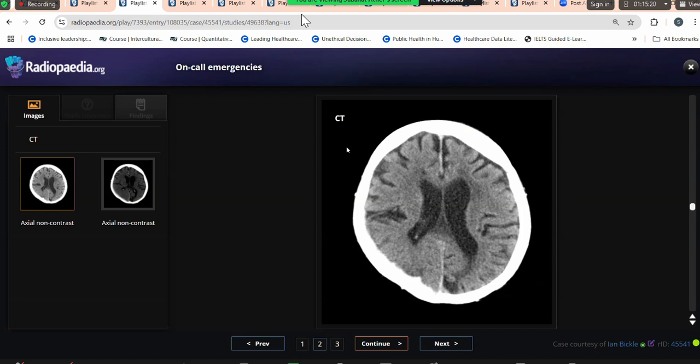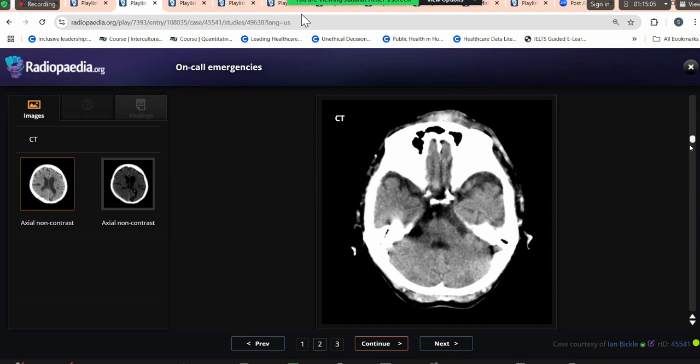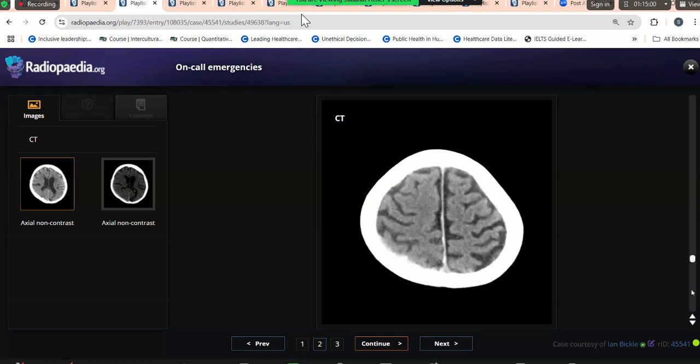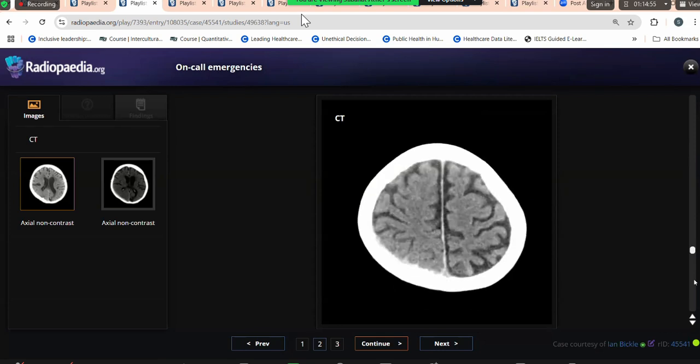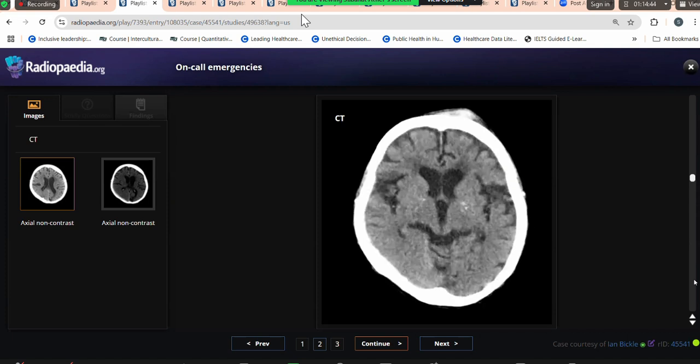Sorry, I was muted. Candid, go ahead. This is a CT brain from A&E of a patient who has presented with altered neurological status. This is a CT scan brain axial section from A&E patient who presented with altered neurological status. I would like to scroll from top to bottom, as I do in my routine practice. I can appreciate mild prominence of the intra and extracerebral CSF spaces, and CSF density area is seen within the left occipital lobe.